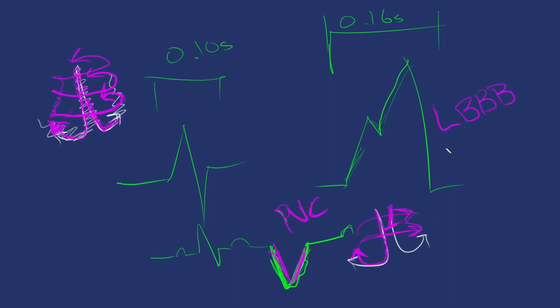Now with the left bundle branch block, we can also have a right bundle branch block. Right. So this would look instead something like this, and we'll see a little bit of a slur, and then it'll come up. My favorite place to look at this, even though technically you're supposed to use V1 and V6, I like lead 1, especially when we're doing telemetry. It's not the true way to diagnose left bundle branch and right bundle branch, but they do look like this typically. Okay, so if you have these bunny ears like this and this weird wide one, it's a left bundle.